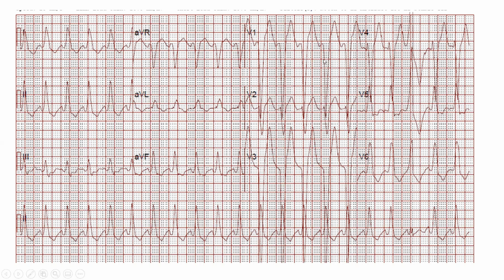Take, for example, the patient with anterior STEMI due to proximal LAD occlusion. Inherently, he will have ST elevation injury in the leads V1 through V3. It may be localized to the leads V1 through V3, in which leads left bundle branch block is also causing ST elevation.